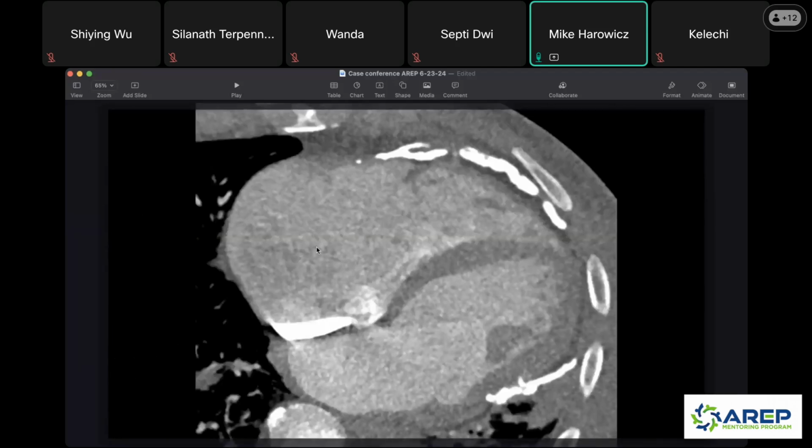And to go back, look at this person's right heart. It's very big, right? So when you get constricted pericarditis, your heart is just not able to pump the same way it can because it's not able to expand in the same way it normally does. That constrictive, that thick, fibrous, calcified pericardium is allowing your heart to not work properly. And so that's why the heart's abnormal. And so when you see this, it's automatic. It's constricted pericarditis. They can do different physical exams and echo findings and cardiac MRI findings to know if it's constricted physiology, but this is constricted pericarditis, period.